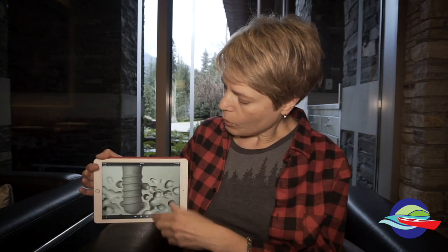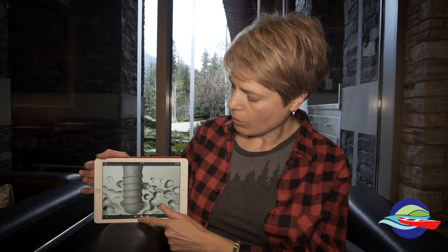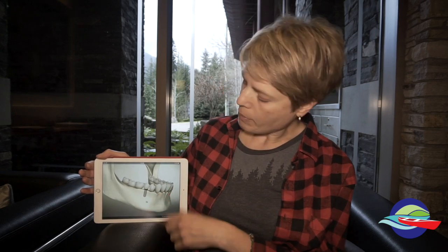And then we put a taller attachment called a healing abutment. And that healing abutment acts as a transitional piece between the time that we've uncovered it and the dentist is able to process the crown that goes in place. So once we've done the uncovering, I explained to the patient it will be about a week to 2 weeks before their dentist can place the crown or start the work to prepare for the crown. And what the dentist will do is remove that healing abutment, the transitional piece, take some impressions. Those impressions will go to the lab, and then they will fabricate a tooth that will fit on top of the implant that Dr. Fritz has placed.